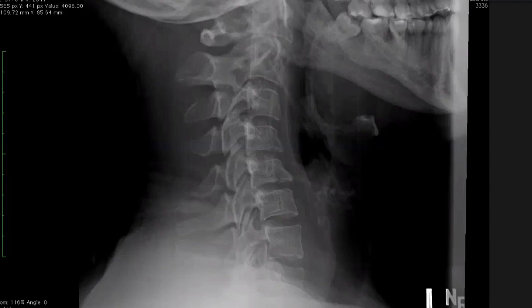So this is not a normal X-ray. We all agree there is loss of cervical lordosis. She has got a vertical kind of injury on the CT head. So if you are faced with this problem, always say, get a CT neck done. Yes, so let's get the CT neck for you. It's a CT neck and upper thorax.